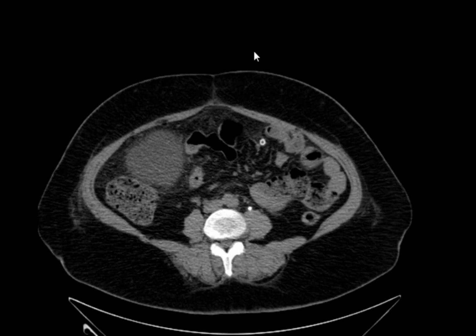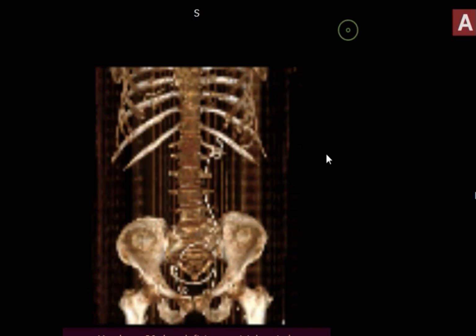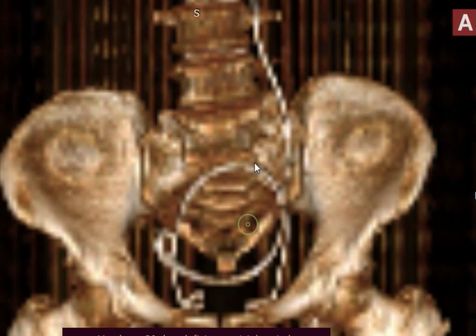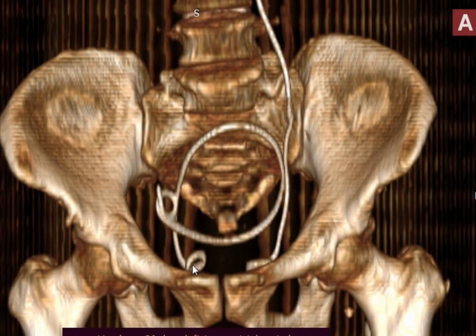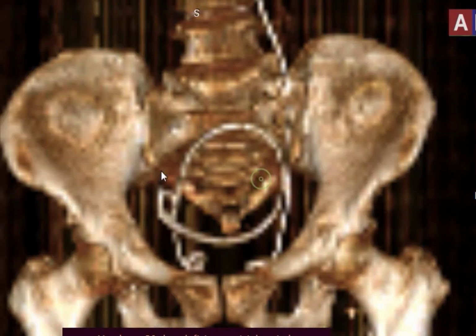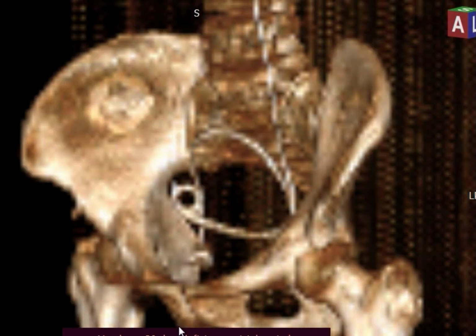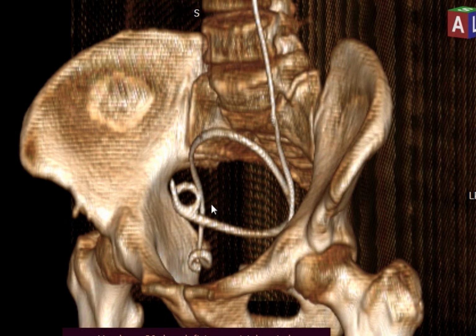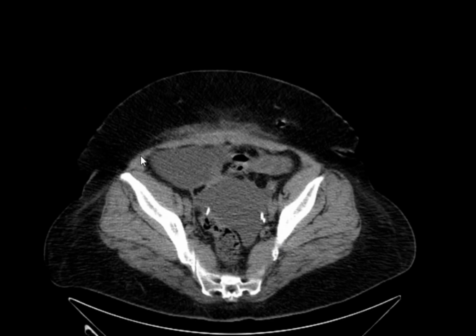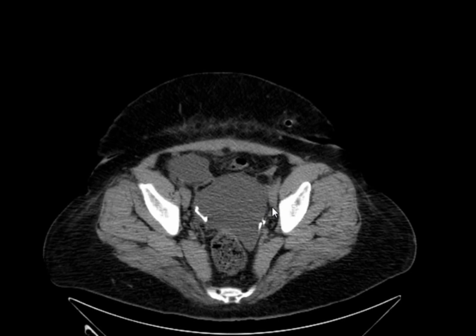Let's go to the without contrast and try to make a 3D. I don't know. This is without contrast. See, this is in the urinary bladder, and then goes up the ureter, and then out of the ureter, and does this loop in the recto-vaginal pouch. You see, like that. In the urinary bladder, goes up the ureter and out of the ureter. And most of it's outside, the vast majority. This is a big urinoma here and here, everywhere.